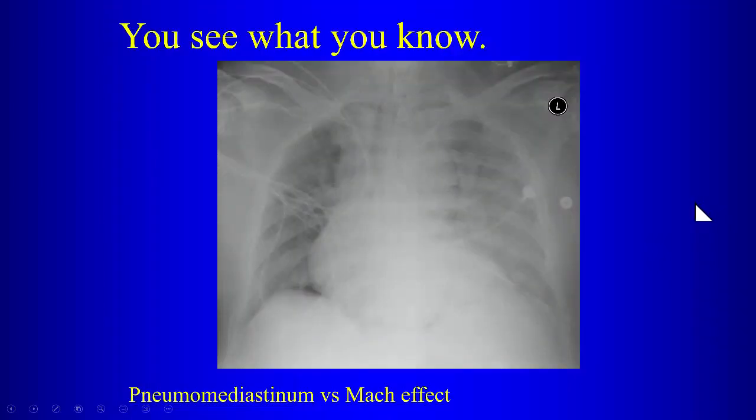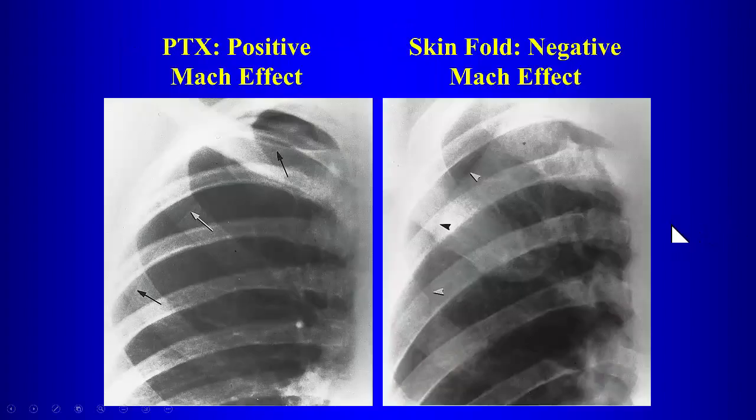One of my favorite expressions is you see what you know. If you realize that that's a Mach effect, then you realize that it's not real. But if you don't, then you might mistake that for a pneumomediastinum.